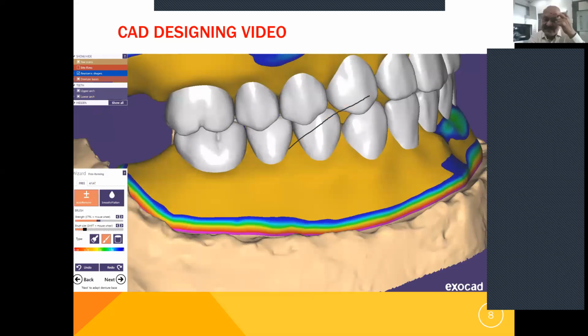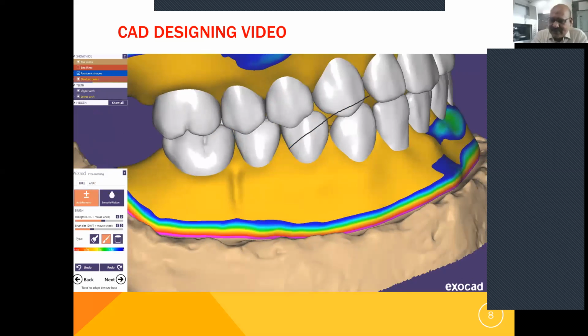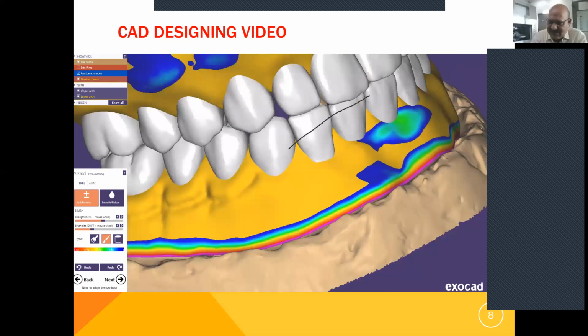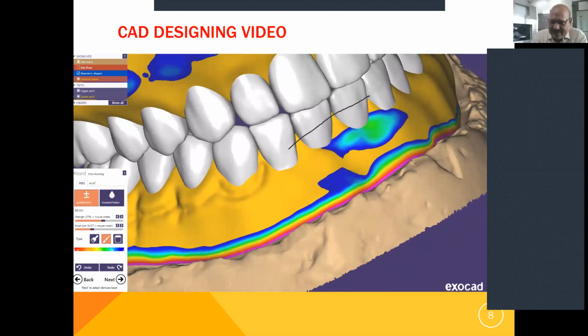So these teeth are finally glued. I use a Bredent gluing agent, that is Visio.link. First we apply a primer and then cure it, and then apply the Visio.link on the base and teeth together. We are just attempting to give a festooning. It is a suggestive kind of thing. It is as per the individual discretion, how much characterization to be given.